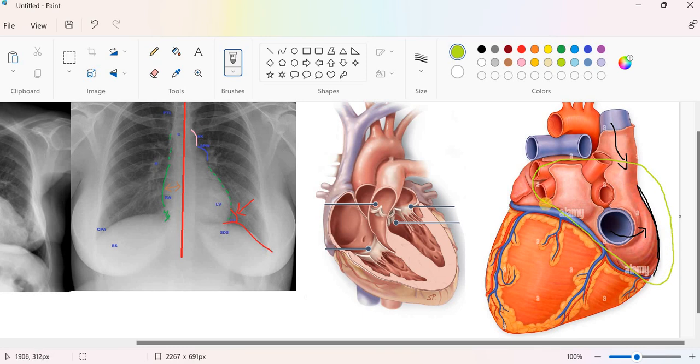So this is when the chamber enlarged. Okay, it is not only pushing the right atrium, sometimes if the enlargement is a lot. Now you can see here that the border of the left atrium is to the right side of the right border of the heart, which is literally the right atrium. So this is left atrial enlargement and how it is happening.